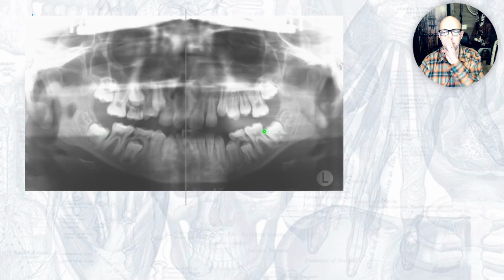So even though the midline is in the center, if I can show that, I was rotated somehow where the back of my head was too far to one side or the other. These ones being widened, here's my left side. This is his right side, so here's my right side. These ones being widened meaning it was closer to the point of rotation. So if I keep my midline in the center, if I rotate that way, now my head is looking right and my right side is closer to the point of rotation. They should be widened. That should be how he was turned. Even though this is in the midline, he was turned a little bit, so he's facing to the right.